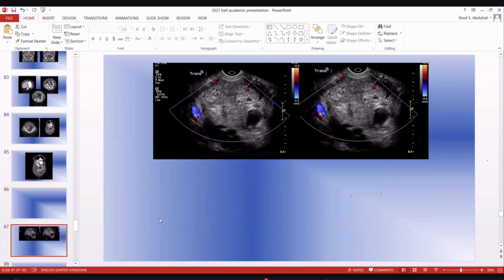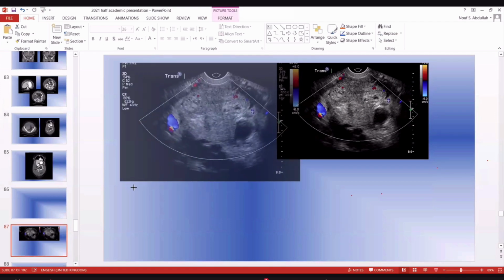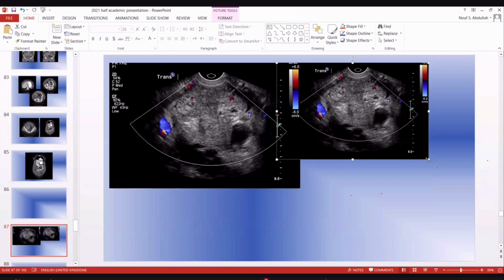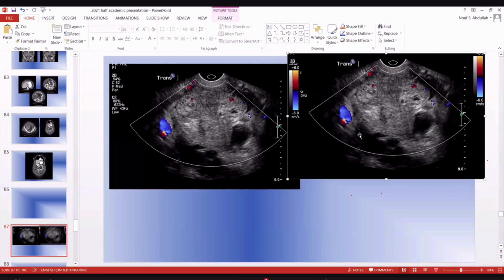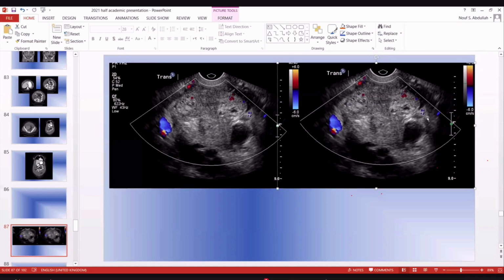This is just another ultrasound case. If you look here carefully and make it a little bit bigger, here you have to decide where this is coming from. This is a pelvic lesion occupying the pelvis. I have to identify whether it is coming from the uterus or the adnexa. If you follow the adnexal vein and you see that it is adnexal, you have to decide whether you are dealing with solid or cystic. This is a predominantly heterogeneous solid lesion with tiny cystic changes, mild posterior acoustic enhancement, and some vascularity.